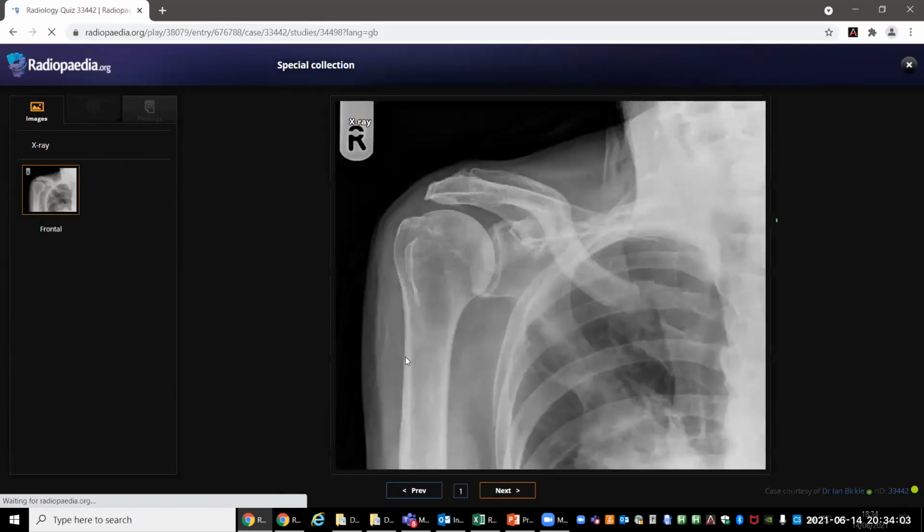So the previous one, you did this very well. However, I don't know why you would want to do a chest X-ray again. It's obvious that there is a destruction here. There's a mass here. You should go straight for a staging CT. And I was actually trying to tell you some history in the beginning, but I guess you did not hear me. This patient came from the GP. So I wanted to see how you would manage this patient that came from the GP.